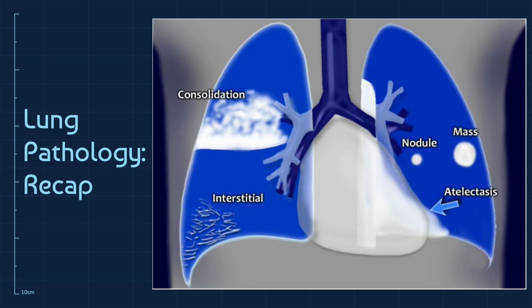So those are the terms usually used to describe such consolidations found. You would describe it as diffuse or multifocal, ill-defined, lobular, lobar, and so on. And then it's up to the pathology team or the diagnosing team to determine what could possibly be filling up the consolidation.